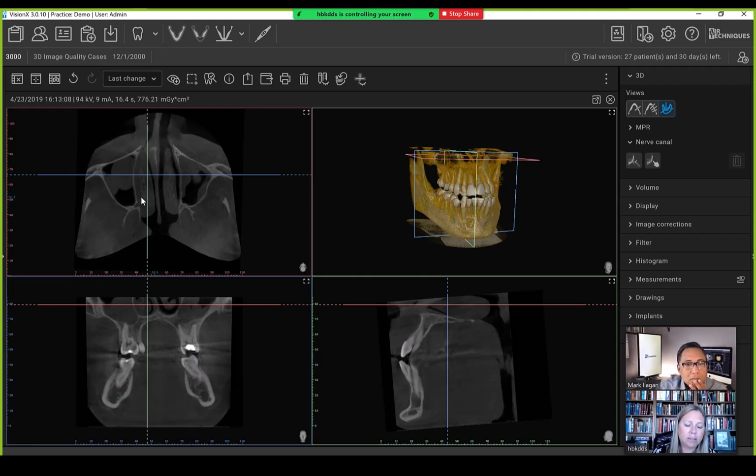And so using symmetry, making sure that everything is rotated perfectly allows us to use symmetry. And so you can compare one side to another. Even if you don't quite remember all of your anatomy, you could go ahead and compare one side to another. So if it's nice and thin and intact, we know that whatever's going on is most likely an acute or allergic situation. Now, again, I think we might have an odontogenic source here for this one. So if you ever have any questions, you can put your crosshairs and look at it in all 3 planes.